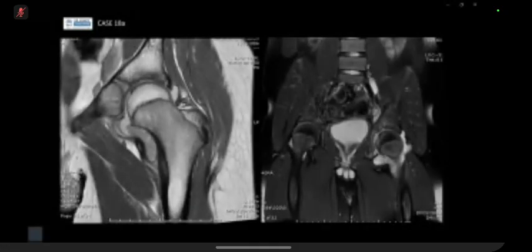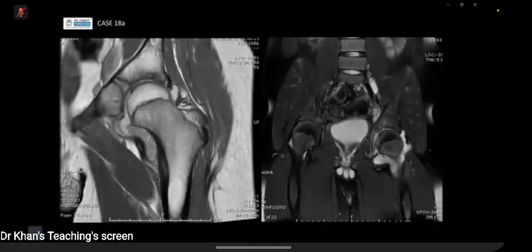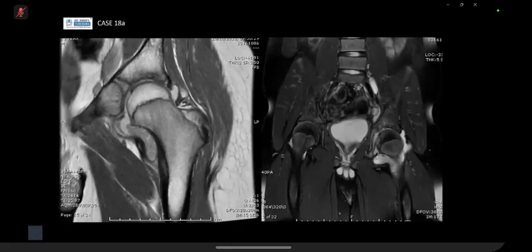However, there is no definite bone marrow edema. At the acetabulum, there is mild breaching of the cortex seen. However, no bony lesion is seen. I'd think of septic arthritis, since there is a large joint effusion with no significant underlying bone lesion or anything to cause it.